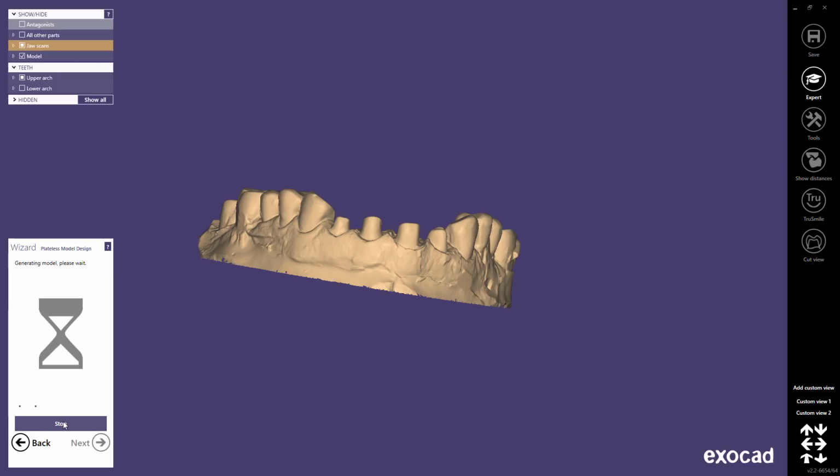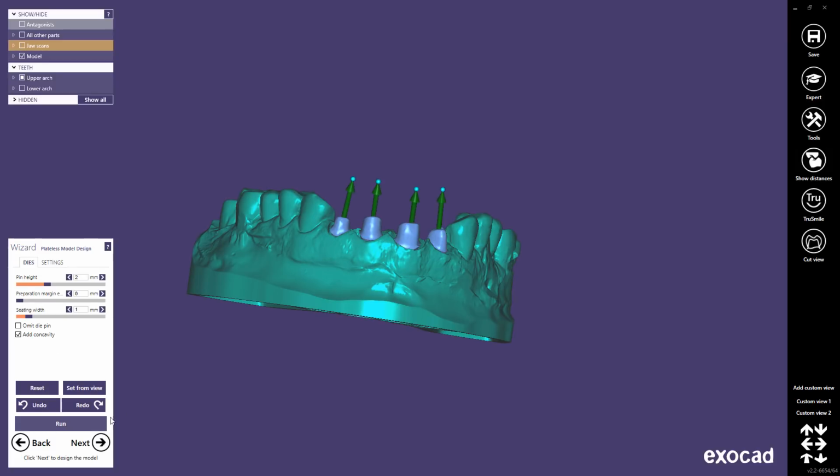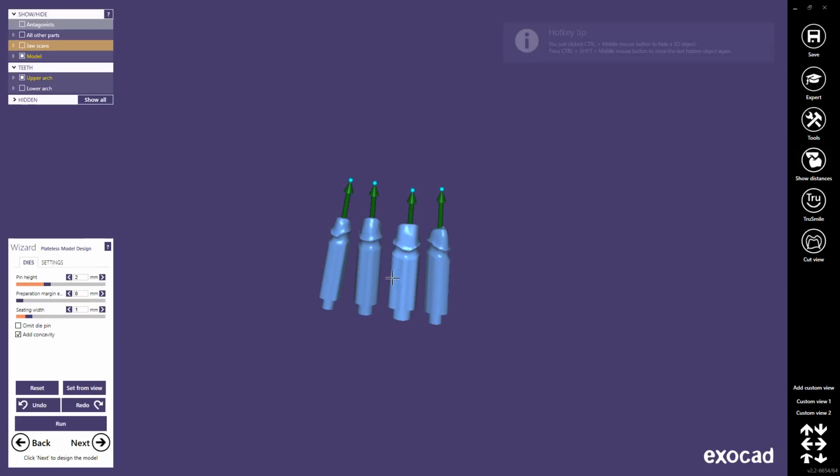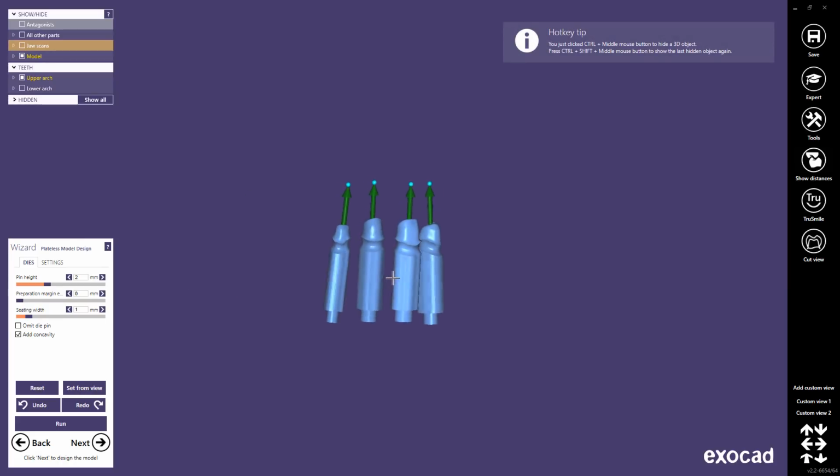This process will take a bit longer than you are seeing here. It's accelerated in this video. And here is the result.